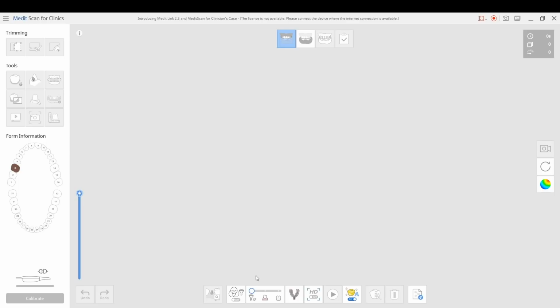So as an advanced user, I'll have color filters on, I'll have this cranked up, and I'll have this again set to full throttle because I don't want to slow things down. I want to pick up as much data as possible, and I'd rather manage the excess data that's getting in the way of what I'm trying to accomplish. New users would be just the opposite. They want to have a low filter setting. They want to pick up as little data as possible because they're not experienced enough yet to control all the moving parts that may hamper you. So a lot of great features. You'll see clinical examples of that throughout this presentation.